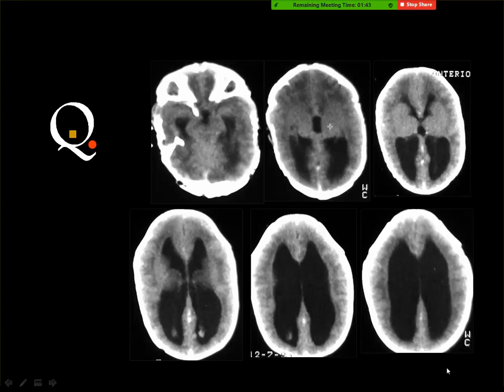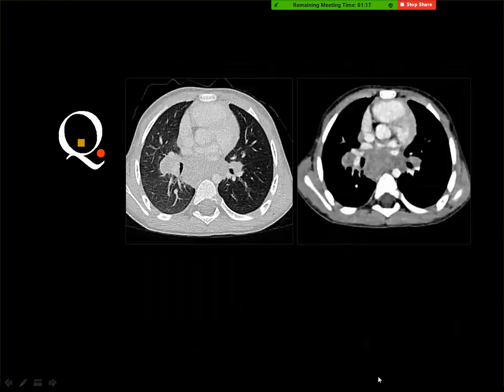Arnold-Chiari? Right. Chiari II. And this is Chiari II. You got a small-sized posterior fossa, attenuation of the fourth ventricle, a slightly dilated third ventricle, dilated lateral ventricles with colpocephaly, and the inverted Vee sign due to hypertrophy of the basal ganglia.